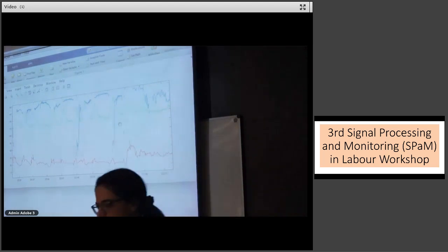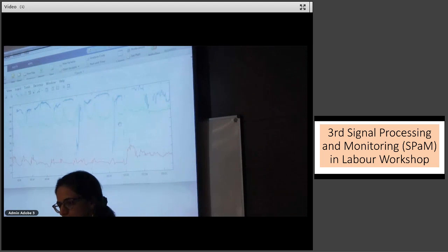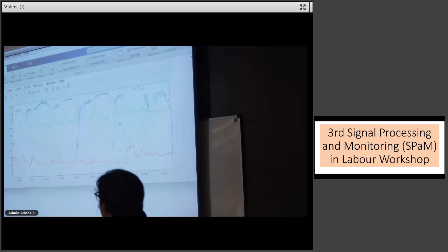I think they need to worry about the ones where labor has not kicked in yet, and the CTG is almost a sine wave. I think for me, that's what makes more meaning if we're talking about unstable baseline, rather than beginning to focus on decelerations that occur in most of our labors. For me, that's really where the action is. This one, the baby is dealing with it. This one, the baby cannot deal with it.